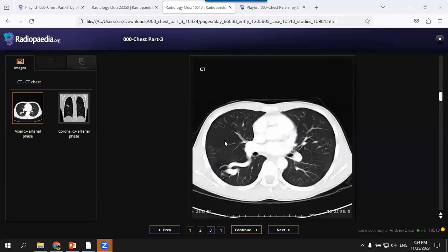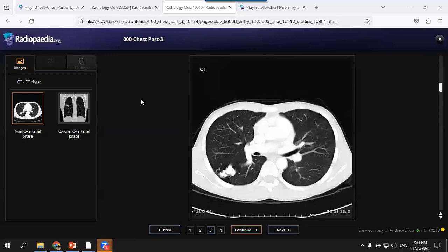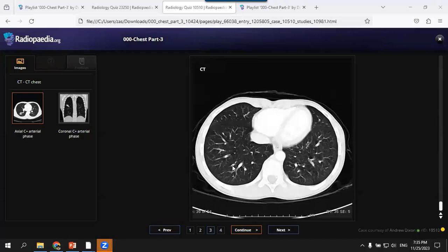Okay. Yes. What is the value of the mediastinal window in this case? You will ask for the mediastinal window because of? Yeah, so to trace the pulmonary vasculature and also to look for any pulmonary embolism, because these patients are at risk.